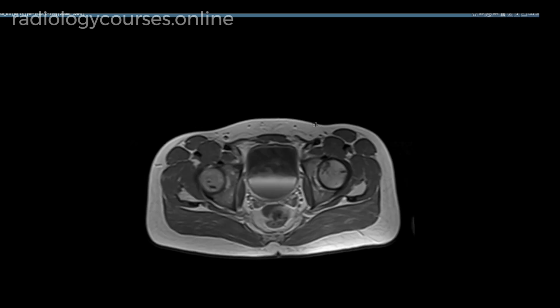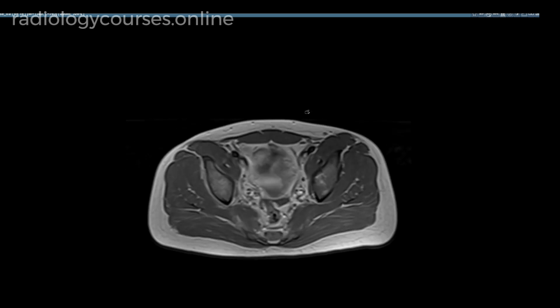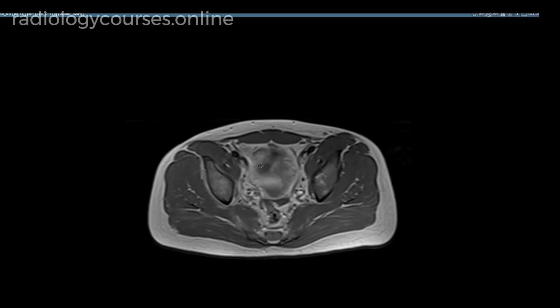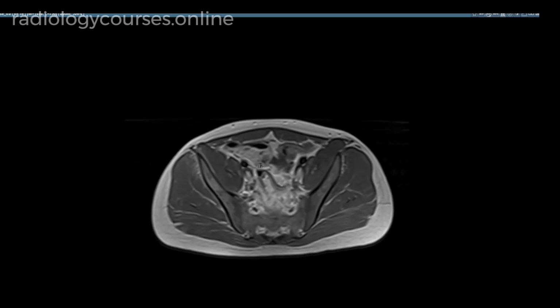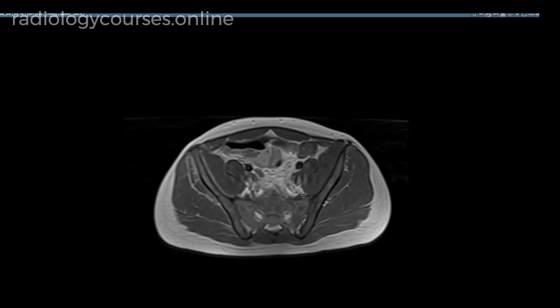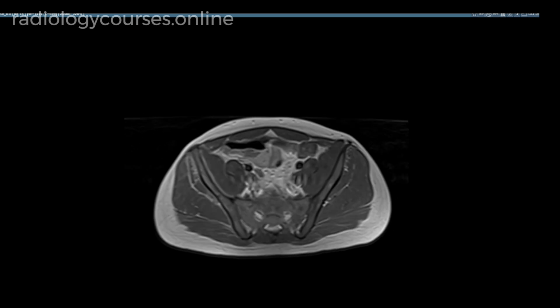acute sickle cell crisis of the bones, resulting in acute pain. Acute bone crisis happens because of ischemia. As there is no enhancement and there is no evidence of any intraosseous or periosseous collection, no intra or intermuscular edema, features are very likely to represent a sickle cell crisis of the bone rather than osteomyelitis. So, in the report, the chief diagnosis would be sickle cell crisis of the right iliac bone and sacrum, and features are very unlikely to represent osteomyelitis.